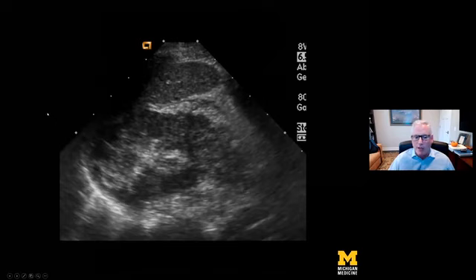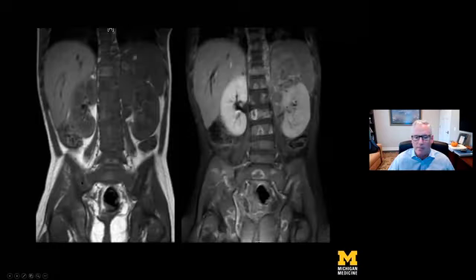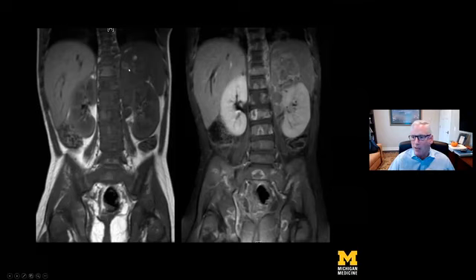We further look at this patient, and on a sagittal left upper quadrant ultrasound, we can see the splenic tip and a large suprarenal mass with associated echogenicity centrally that represents the calcifications. A little bit of shadowing here. On this patient's MRI, we can see that there's a suprarenal mass, heterogeneous on T1, mostly isointense to muscle, but with some bright foci related to hemorrhage or mineralization. Heterogeneous enhancement above the kidney with mass effect, and MRI is beautiful not only to show you the spinal canal, you'll see that, but also for metastatic lesions throughout the visible skeleton.